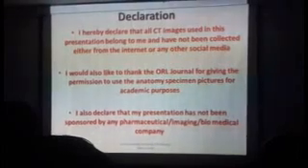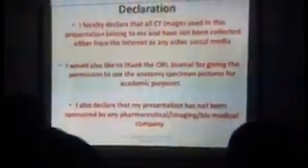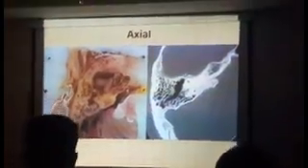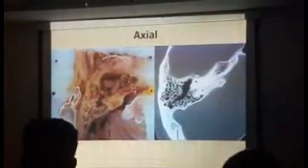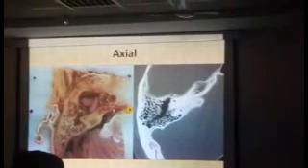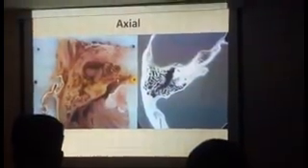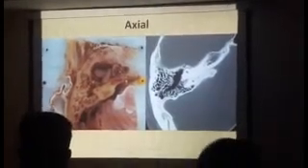I thank the ORL Journal for allowing me to use the gross anatomy pictures that you will see during the presentation. We will have an accompanying gross anatomy picture so that it helps you identify these structures. However, I'd like to make one small point here: for the rest of the structures, the exact correlation might not be available, because obviously they are not from the same patient. So you might find some differences as far as the rest of the structures are concerned. Here I've tried maintaining the correlation mainly in respect to the ossicles.